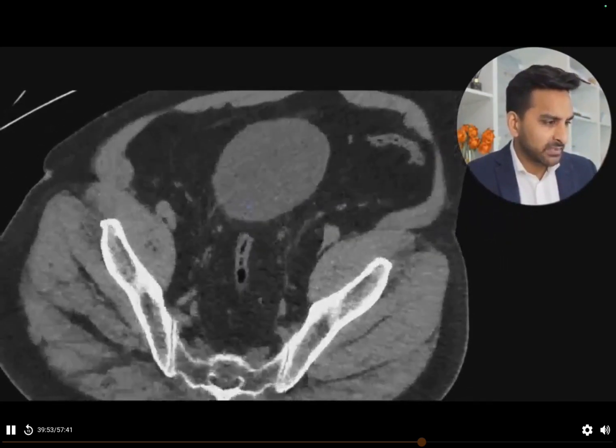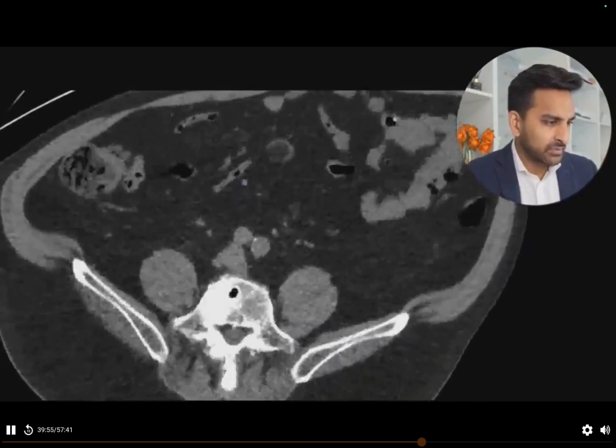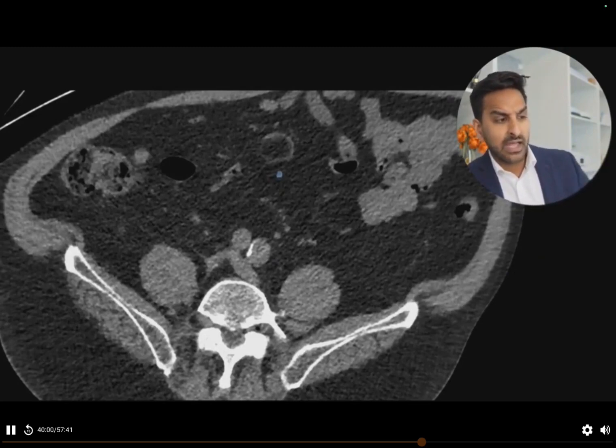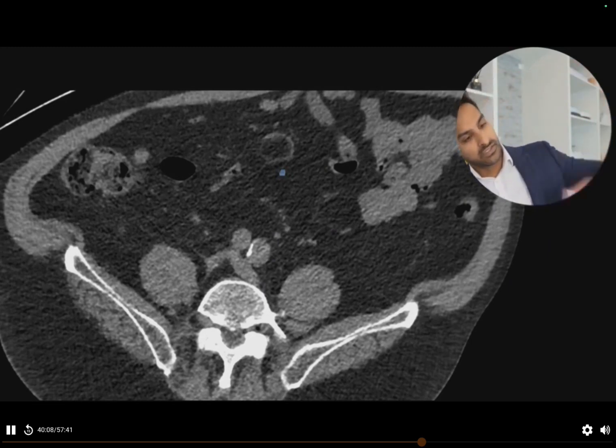Let's follow this up again. Sigmoid colon, sigmoid colon. And actually, it's quite near the sigmoid colon, right? And it's on the anti-mesenteric side. Now, we've already seen that sigmoid colon can be very, very mobile. And so this sigmoid colon loops up in the middle of the abdomen and comes back down again.